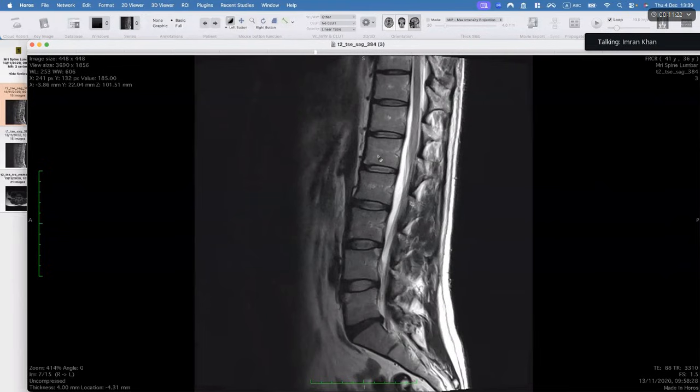I'm sorry, I don't mean to interrupt you, but I'm going to give you tips while we go through this process, okay? If, for example, you are in the exam and you catch something that you're talking about and the examiner wants to move away from it, he'll just say something like, no, don't worry about it. So point out where you saw the edema at the L2. It's just to let you know, I'm not trying to be rude. I'm just trying to tell you that I don't think this is where the abnormality is. So if you can point out where you saw the edema in the pedicle, I'll just scroll through it.